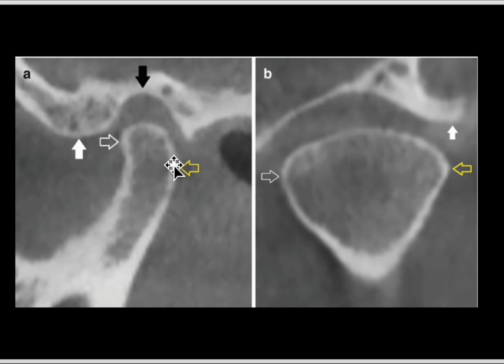It is covered with a very thin cortex. And this is actually very strange because this part is subjected to a lot of loading. This thin part is actually a sign that the disc and the fibrocartilage are just doing their job. If there is a disc derangement, however, or the disc is positioned forward, then we might see that this part is thickened.